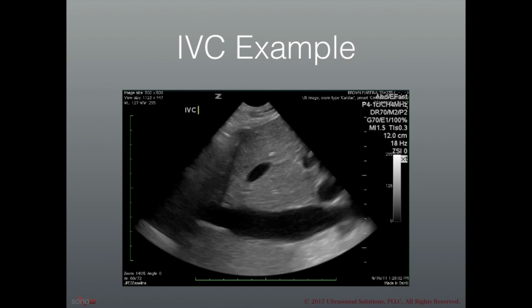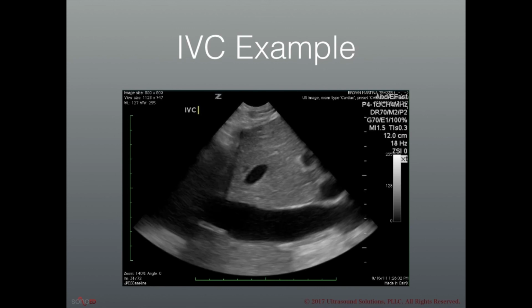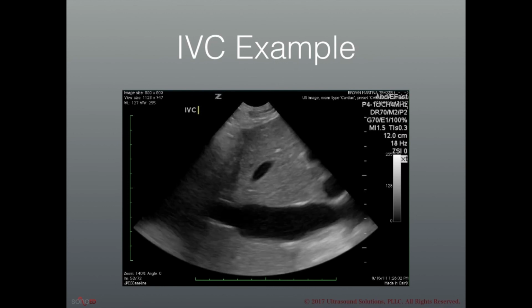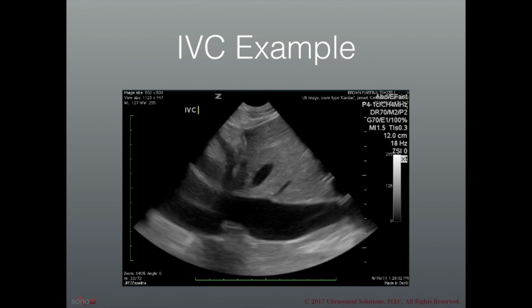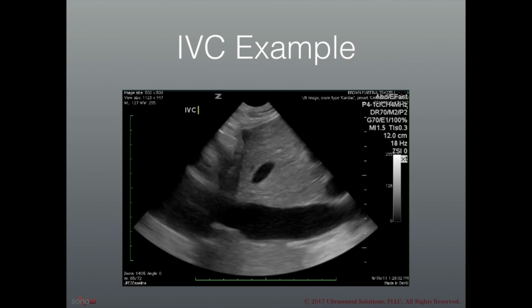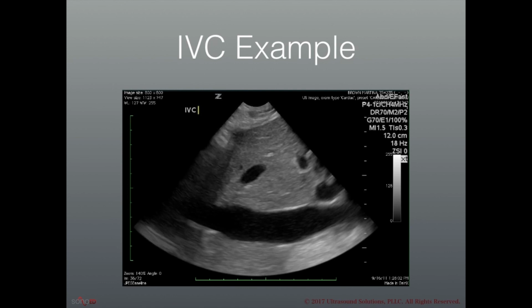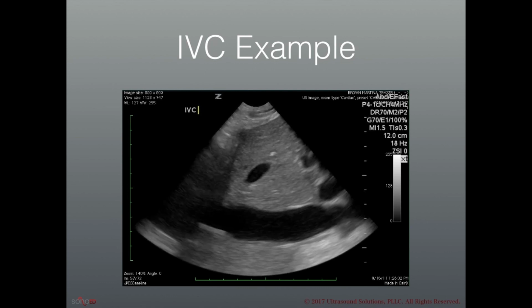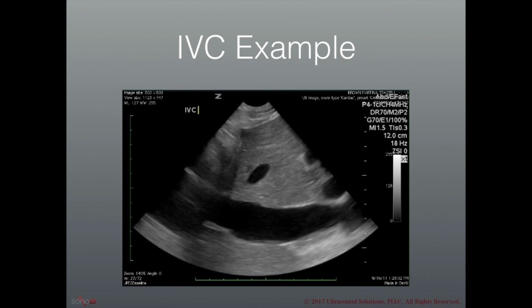And if you look closely in this video, is there another potential cause for hypotension that you can see? Look up above the diaphragm where you see the heart moving. Do you see anything on this somewhat limited view of the heart that could be contributory to hypotension? Well, the heart is tachycardic, and there's a fluid stripe around it in the pericardium. So could this patient have a large pericardial effusion or tamponade? They would definitely need a cardiac ultrasound to find out.